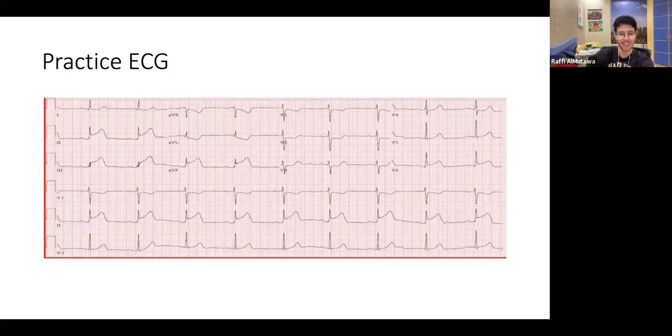How about we do this one? Let's see. Oh, this is a STEMI. Oh, you guys already said that. Never mind. I didn't mean to say anything.